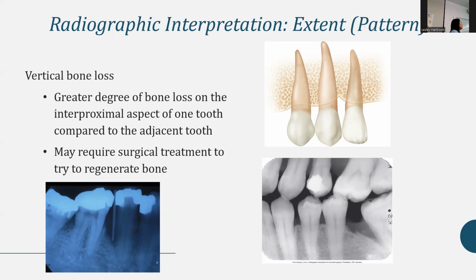Yeah, so I don't remember if that's something you actually have to document in clinic or not, but you might actually have to say that. If you notice that most everything's horizontal, it would be generalized horizontal bone loss with localized vertical bone loss between 29 and 30, furcation involvement on tooth number 31. So you will start to spell out the areas that have something more severe in the localized area, but then generalized. This is what's happening generalized.